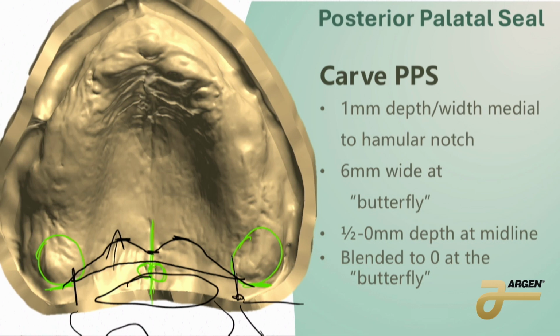So we'll taper that in, and then from here, you don't really want to be very deep over the midline. Over the midline, that midline suture can be a little bit firmer, a little more hard. So you don't want to have it pushing in too much. It can be uncomfortable. So typically right in the middle there, I don't go as far.